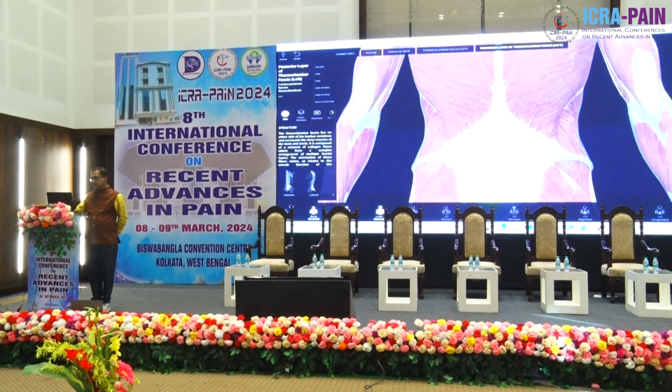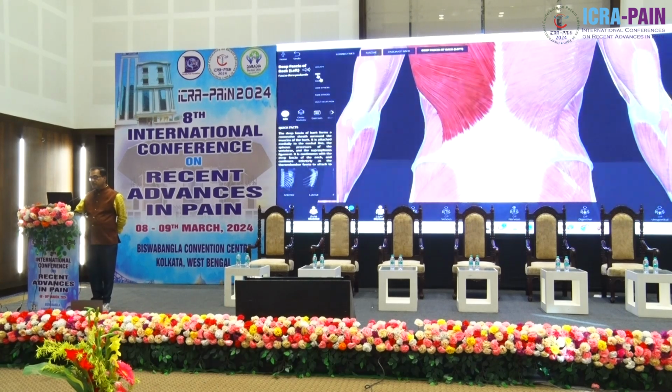So this was the deep fascia. So this is the deep fascia. So if I am removing this deep fascia, the muscle, what is this muscle? Who can tell? This muscle? Latissimus dorsi, very good. So this is latissimus dorsi.